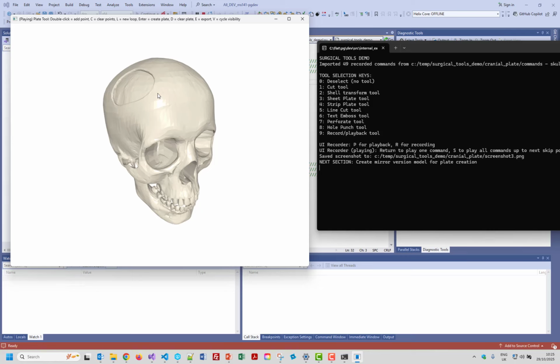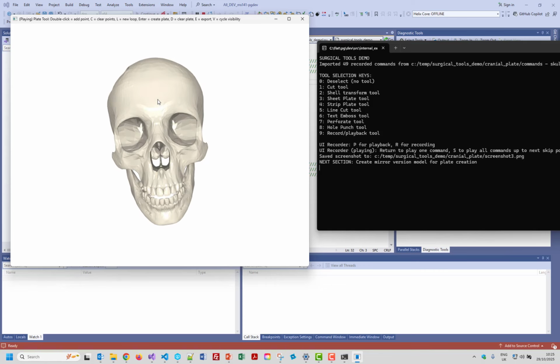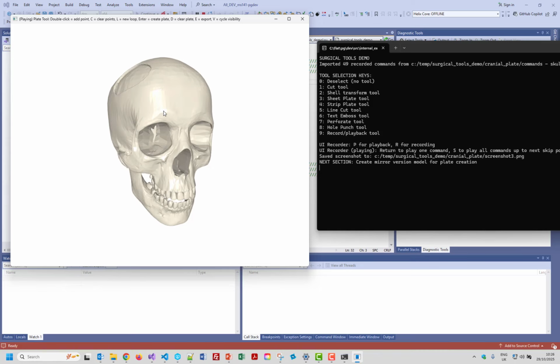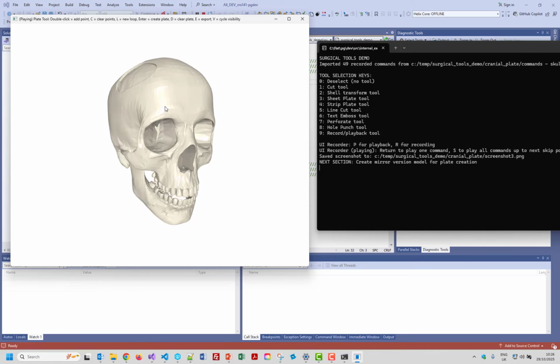But that really depends on where you've decided the center of the coordinate system is, and how that fits with the line of symmetry. If it's slightly off, then your results are slightly off also. So in this case, we've found that registration alignment is a more accurate way of doing it.